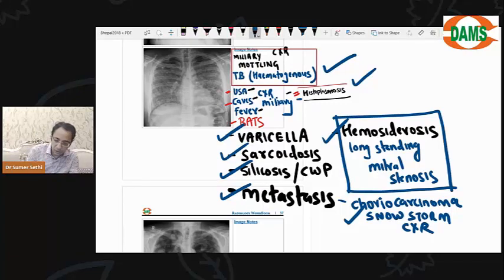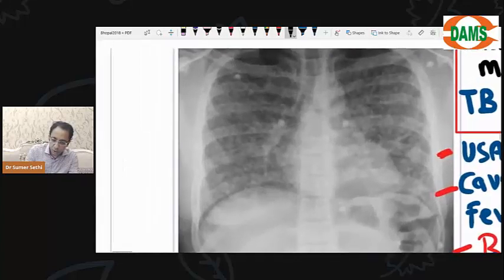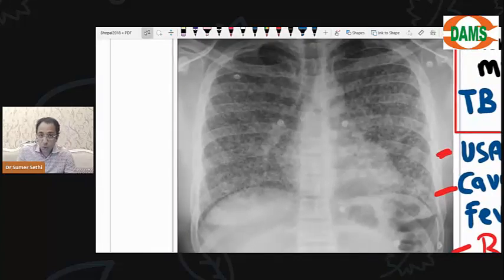Okay, very good. So what happens is in the exams, they often try to trick you by showing you miliary appearance, but the answer would be something else other than TB. So that is a common trick used in the exams.